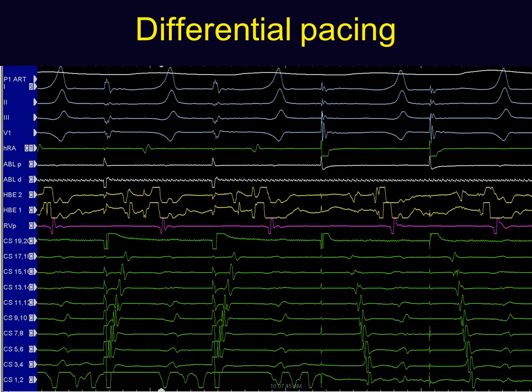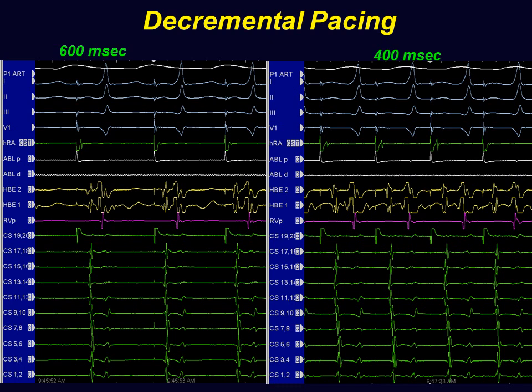When you have a patient with pre-excitation referred for ablation, and regardless of where you pace, CS distal or switching to high right atrium, the pre-excitation remains fixed and the stim to pre-excitation is increasing, suspect a fasciculoventricular pathway. You can see that whether it's 600 milliseconds or 400 milliseconds, this pre-excitation is beyond the level of the AV node. It's more of a His leak into the ventricle, and there has been no tachycardia ever described because of this, and so this should not be ablated.